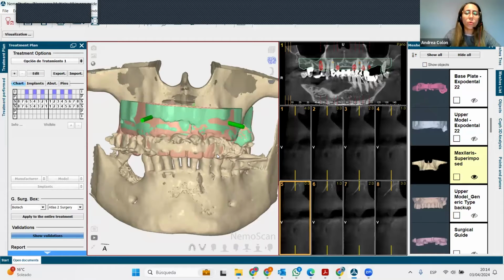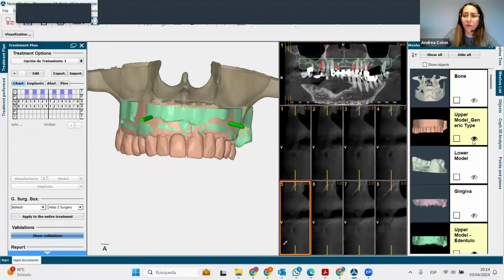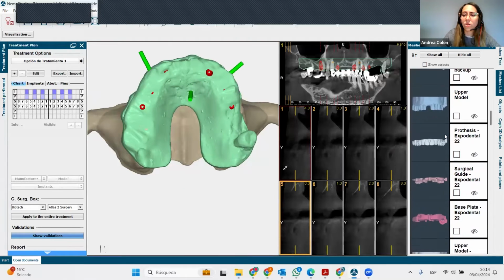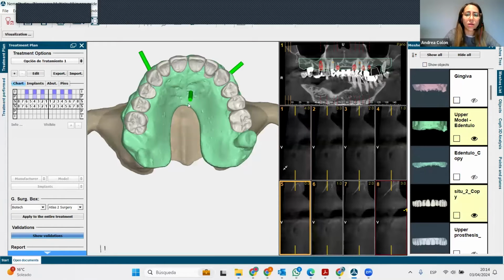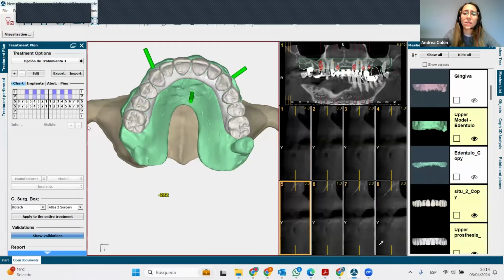And then, saving this time, you only need to go to the planning part where you get to place your implant. In this part, for example, you will be able to create a wax-up from a full teeth model, or from a full edentulous model with virtual extractions, which will be here as different meshes. You can do your wax-up. You can also import a wax-up from another software if you want to. So this is open to export any mesh or import any kind of records.